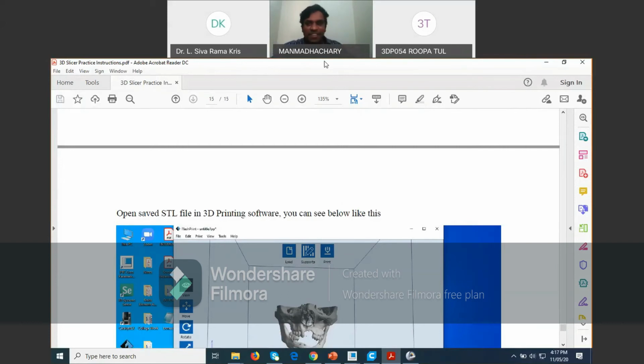I think everyone got it, na? Sir, shall I continue for the next session? STL file slicing, you do it, please. Yes, sir. Already no questions are there.